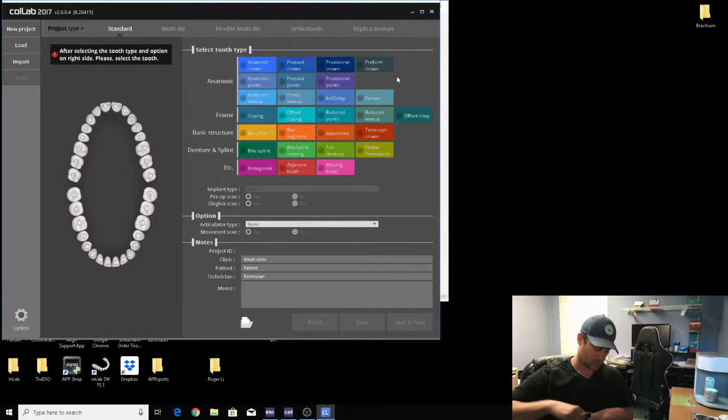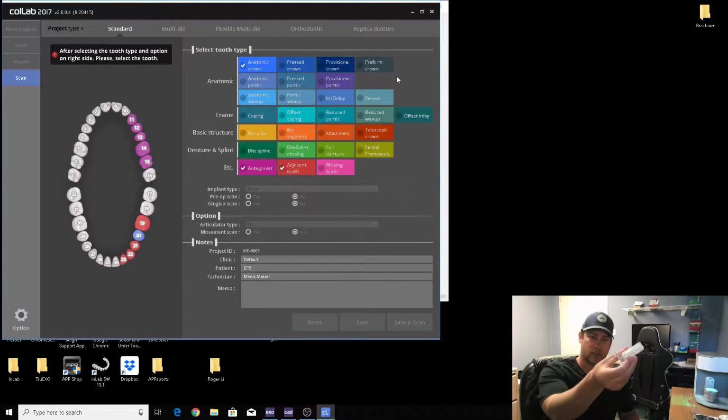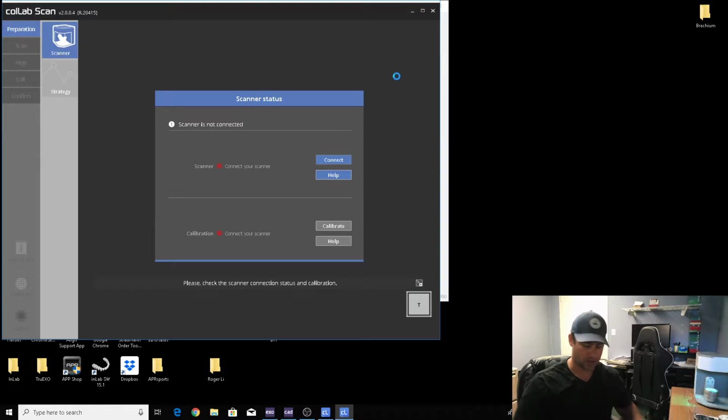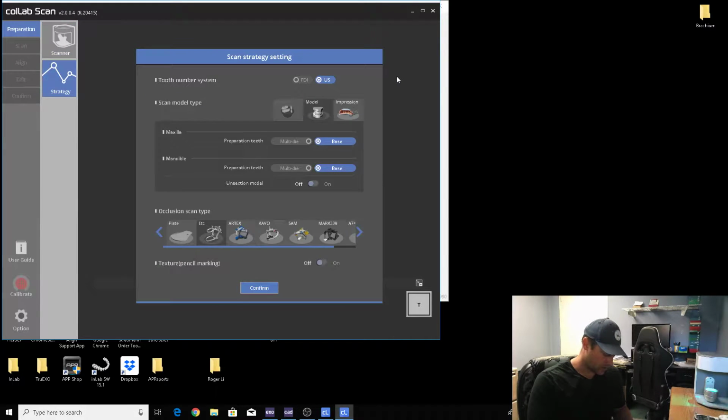Scanning. I always scan the solid model. That's what we do here. We pour plug dye. Just makes everything way more accurate. There's less movement in the models. Just makes everything a much simpler process. I like to use a towel to clamp these down because it'll turn your fingers raw after a little while.